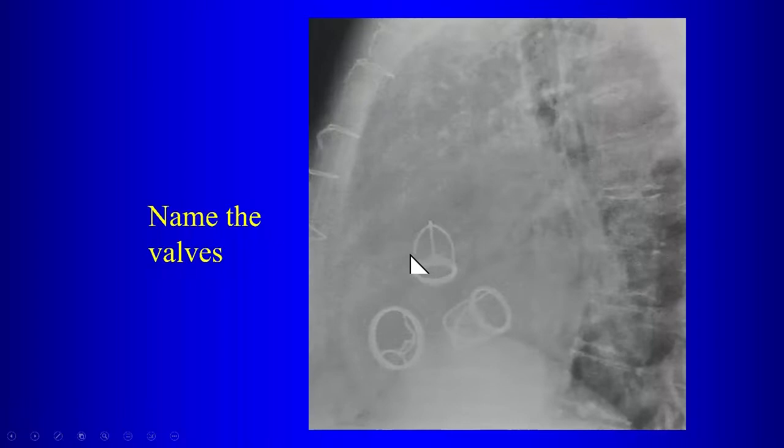We're doing NJMS first. So the aortic valve, this is this one. Mitral? And tricuspid. Right. So we said that to name the valves on the lateral view, we draw a line from the bifurcation of the airway anterior here to the anterior costophrenic angle. We look in the middle of the heart. Just anterior to that line is the region of the aortic valve, and just posterior to that line would be the mitral valve. Notice the aortic and mitral valves are close together.